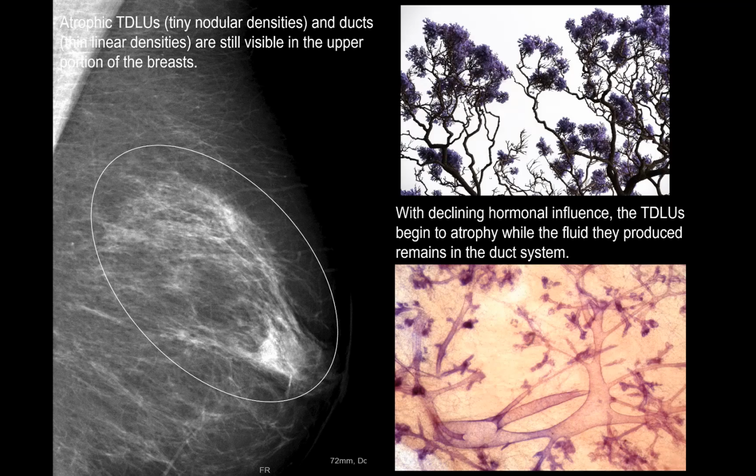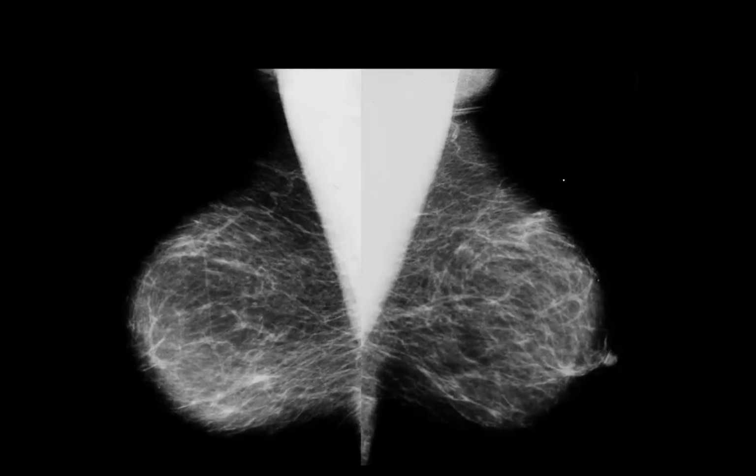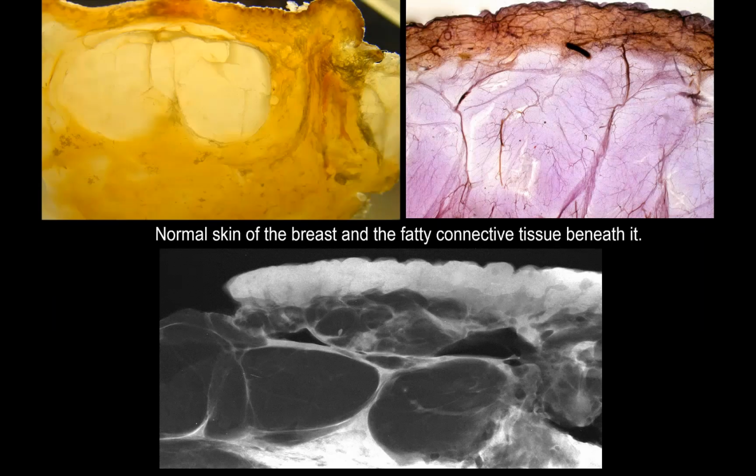Wintertime. You see? And this is an absolute dream of the mammographer. You see, the ducts are there. The ducts are skinny. They don't become more or fewer. No, only the leaves are leaving. And then we can find every small cancer. Pattern 2, easy, really the dream of the mammographer.